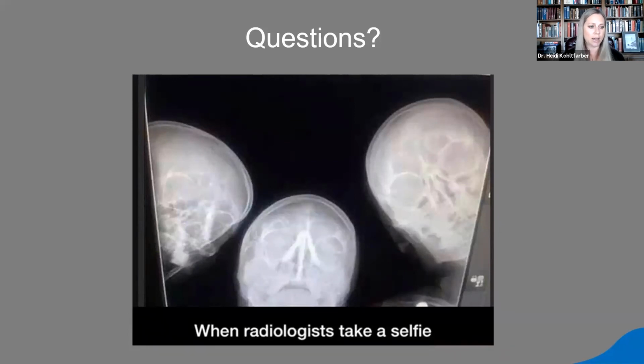If you're looking at the condylar heads, you could definitely see a difference when looking at a 0.1 millimeter image resolution versus 0.4 millimeter image resolution as far as the detail that you can see. But then we have to decide how important is that detail. If we don't catch a small erosion on day one with 0.1 millimeter resolution and we just have 0.4, what's going to happen? Well, the erosion will get bigger and we will eventually see it. A lot of the larger fields of view are going to be a lower image resolution because we are trying to keep the dose down.